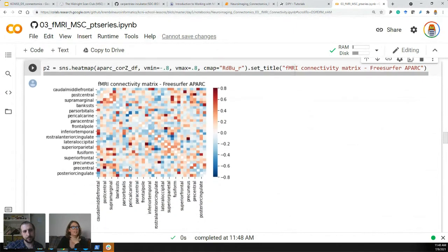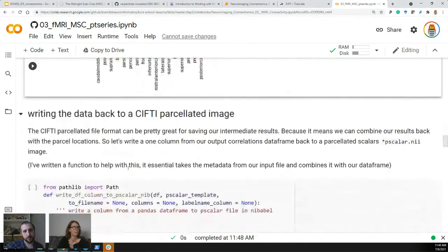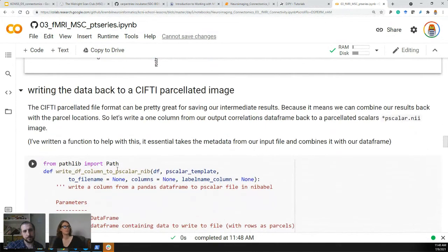And then the nice thing, because we had the p-scalar file, humor me, I wrote these two ridiculously large functions, but they do two things that are very useful when we get to the plot that I'm going to get to below.